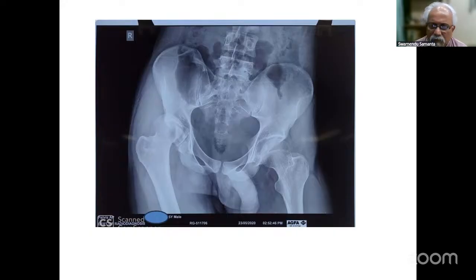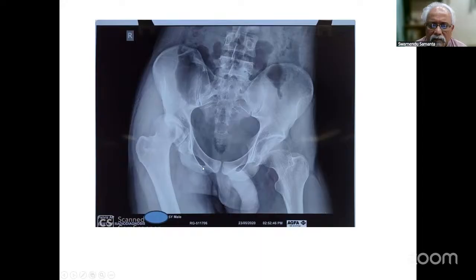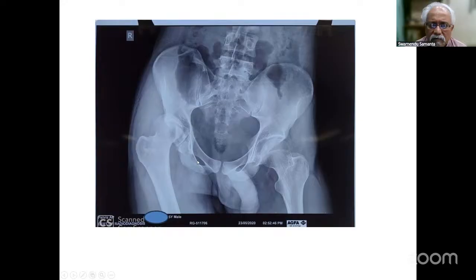Then in the theory, when they ask questions, they can ask whether you can delineate the lines when we read the acetabular radiograph. Suppose you can see my mouse over there, can you tell me which line this one is? This is the anterior column line, sir. This is the iliopectineal line. And this line where the mouse is going? This is the ilioischial line.